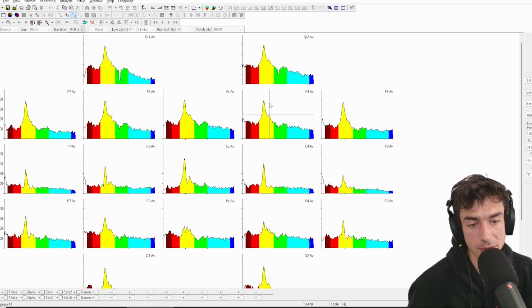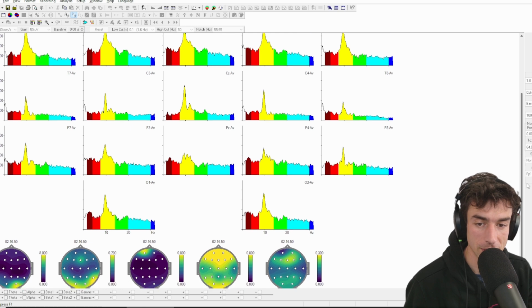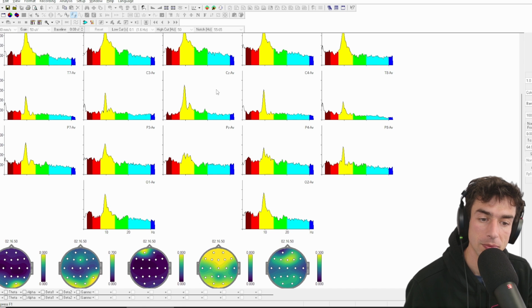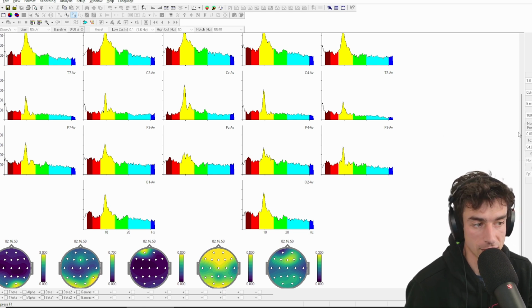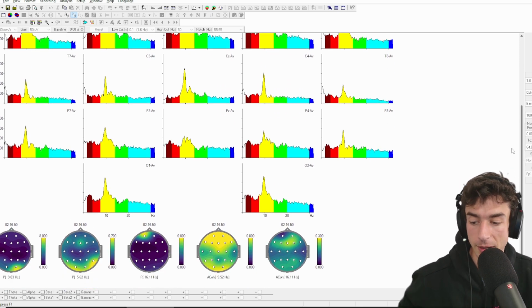And it's not impossible to see muscle tension with that distribution. And it's not impossible to see cortical beta spindles in that area with this background presentation, as far as everything else that's going on. So it may or may not be significant.